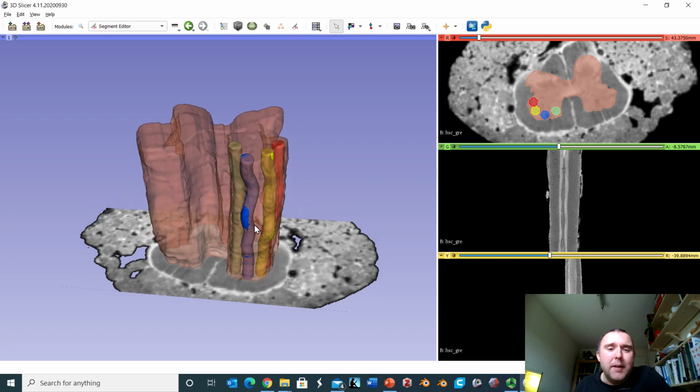But I think the main message is to realise that the grey matter of the cord is not homogeneous. There are distinct cell populations, and these exist in 3 dimensions. So that's a look at the grey matter in more detail, particularly from a functional point of view. I want to end just by looking at something which is a bit interesting in this data set.